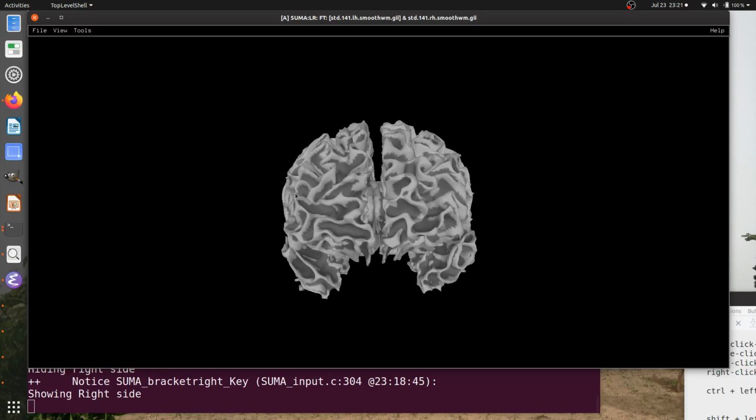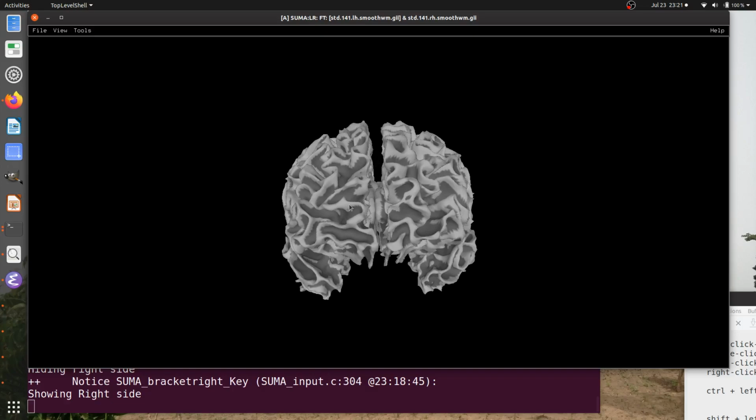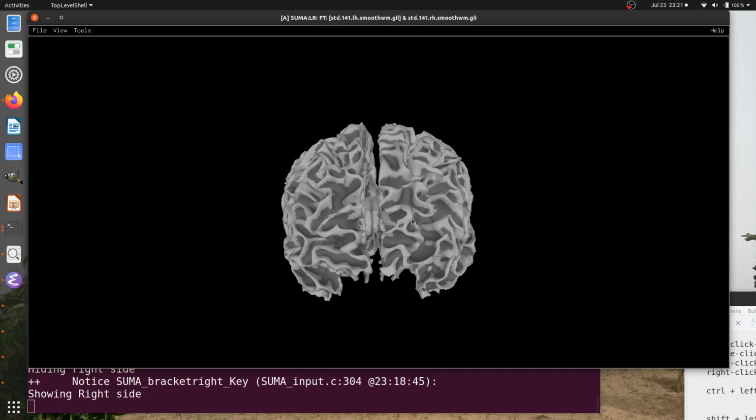If we think of this as being like a balloon, we could think about inflating it, and so the same number of points would stay there, but now all these interior parts would become more flush with the outside, and we might be able to see things more.